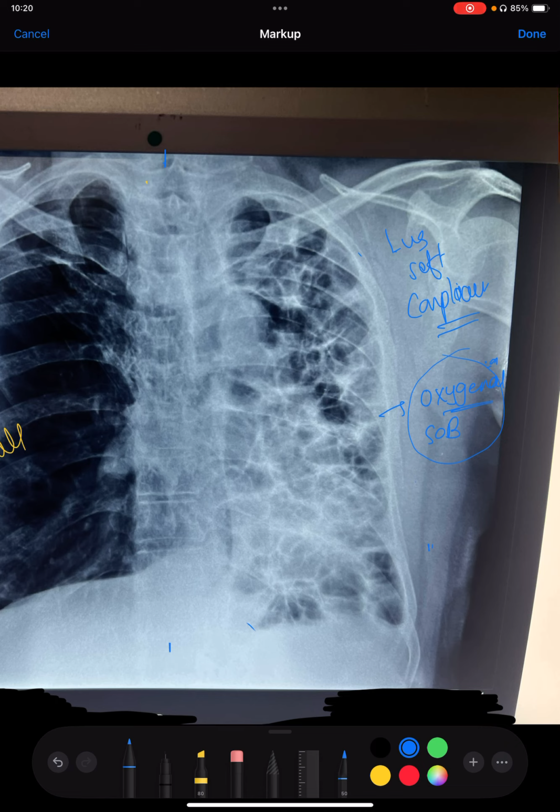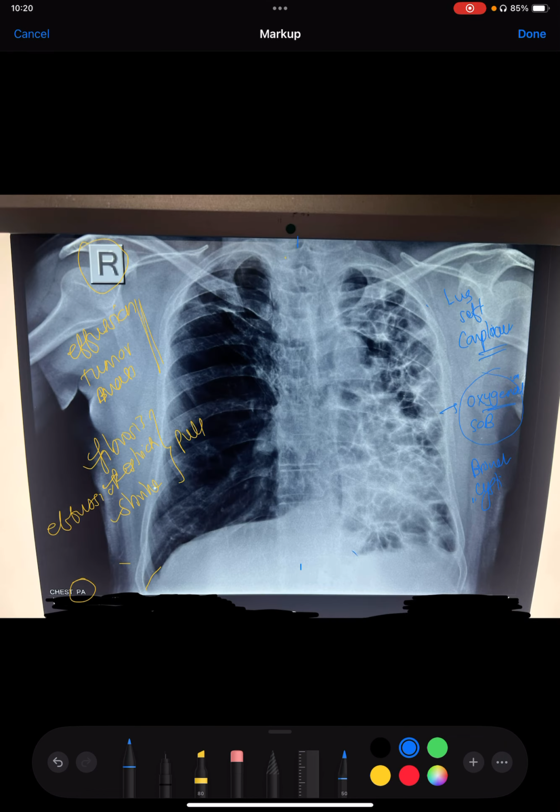So in this case, the patient had chronic bronchiectasis, that too with cystic chronic bronchiectasis. So the patient had extensive lung damage with extensive chronic and cystic bronchiectasis, which involved not only the alveoli but the bronchi, the terminal bronchi, and a significant portion of the respiratory tract.